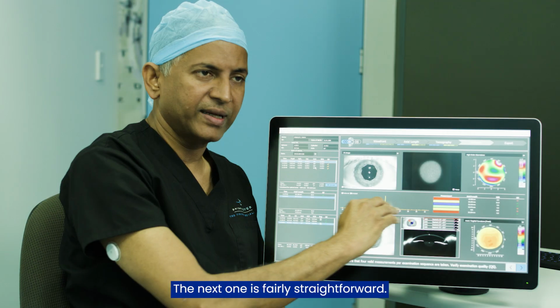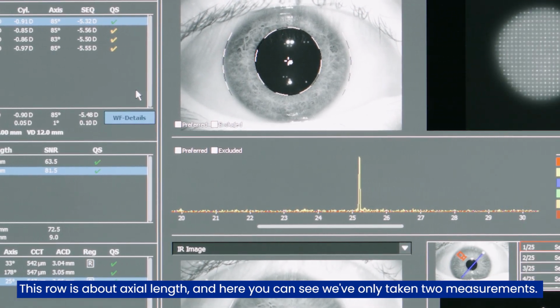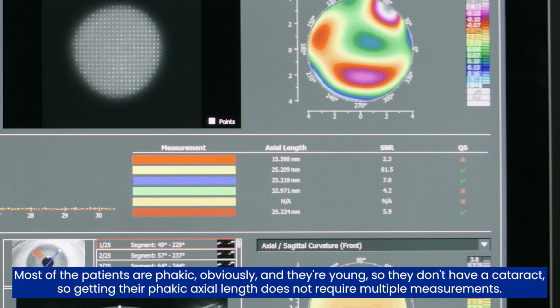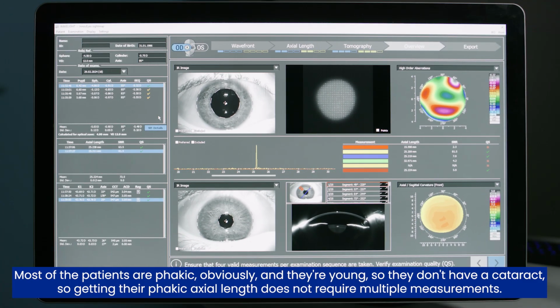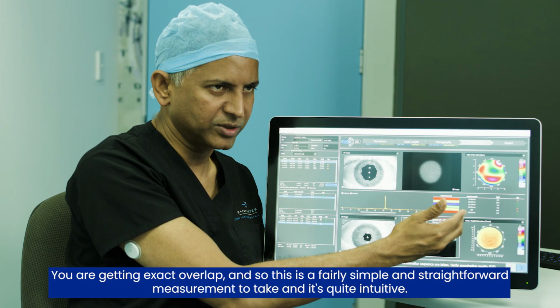The next one is fairly straightforward. This row is about axial length. And here you can see we've only taken 2 measurements. Most of the patients are phakic, obviously, and they're young, so they don't have a cataract. So getting their phakic axial length does not require multiple measurements. You are getting exact overlap. And so this is a fairly simple and straightforward measurement to take, and it's quite intuitive.